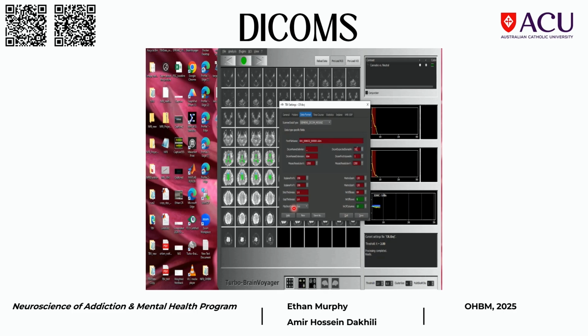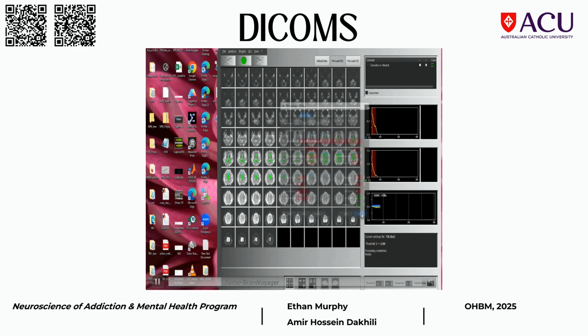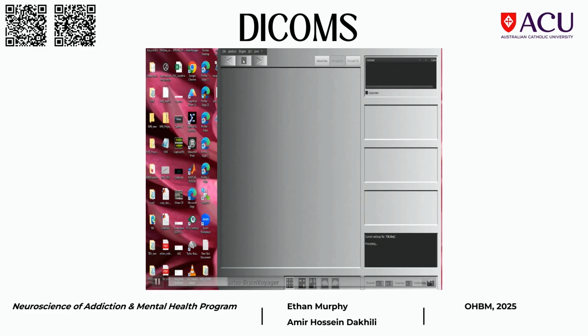Wrong. You started with a good word, wrong. Yeah, the problem was the wrong DICOM series number actually. The series number that TBV was expecting to receive data from was not correct, so it should be another series number. TBV just didn't receive anything with that specific series number and said, okay, I couldn't find it.